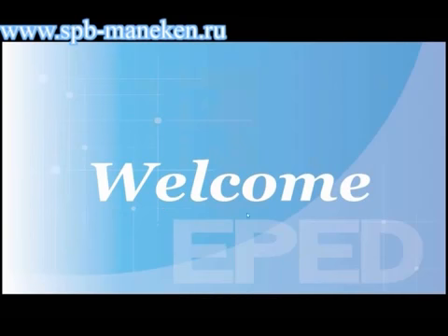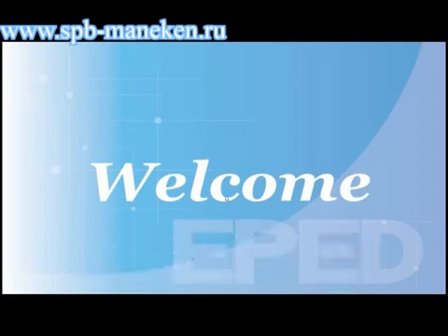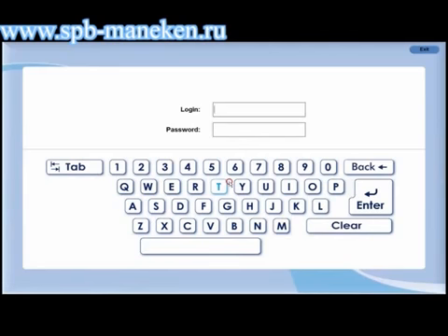When you get started with the CDS-100 dental training system, a welcome sign and the company's name will be shown on the opening screen. You may click anywhere on the screen to proceed to the next step.